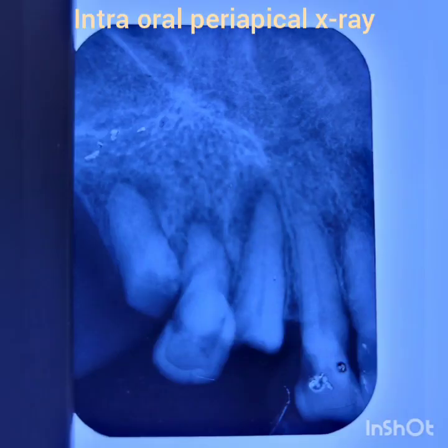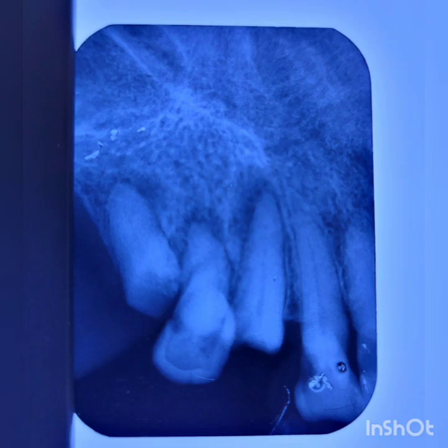Now the second example, this is intraoral x-ray, that is again intraoral periapical x-ray of maxilla anterior region showing lateral incisor, canine and premolars with periapical region. All teeth are carious and canine and second premolars have crown loss. Canine and premolars have around 2 mm periapical radiolucencies with ill-defined margins, which favor diagnosis of chronic periapical abscesses or infected radicular cysts due to caries.